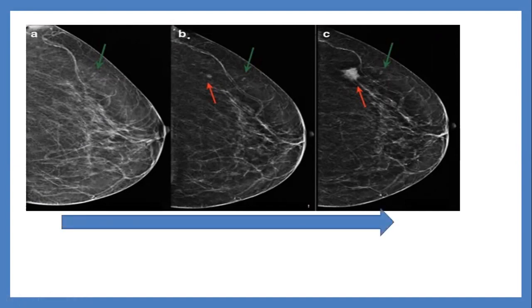Yes, okay. So the earlier one showed a tiny intramammary dense lesion.